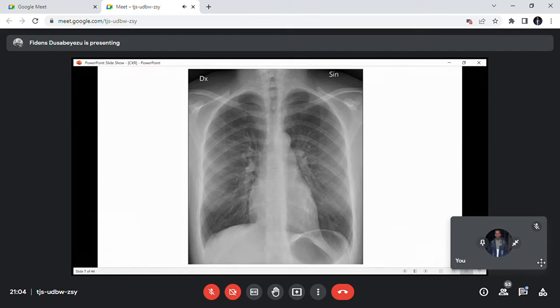Yeah, by the way, we tried if you have remembered them yourself. It's good. But even the superior vena cava is there. This is the superior vena cava. The aortic arch and the ascending aorta are there. Can you see the ascending one? There is the pulmonary trunk, that's coming from the heart. There is the descending aorta here.